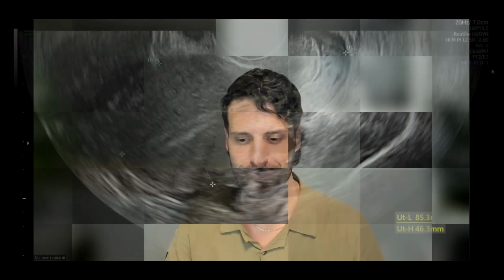We're going to be looking at a different pathology on today's ultrasound, though there will be some familiar pathologies as well for those of you that have watched episode 1 already. I'm going to hopefully be able to take you through some standardized approaches for assessment of ovarian masses.